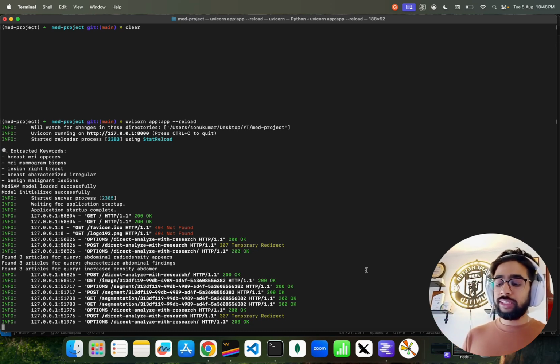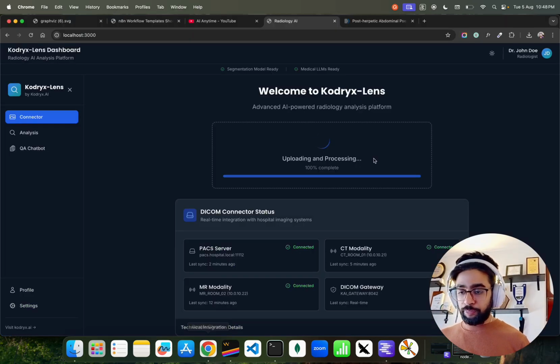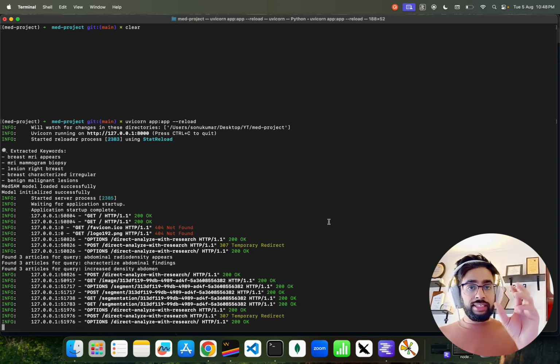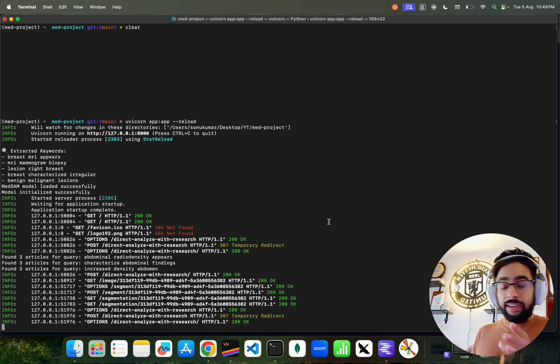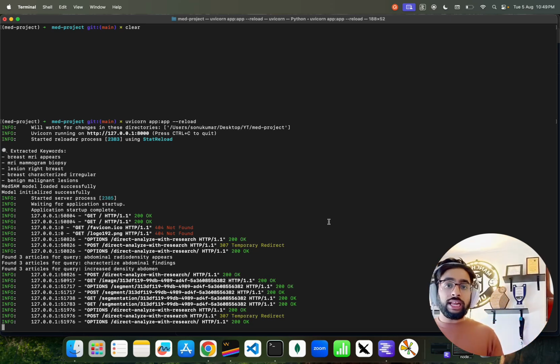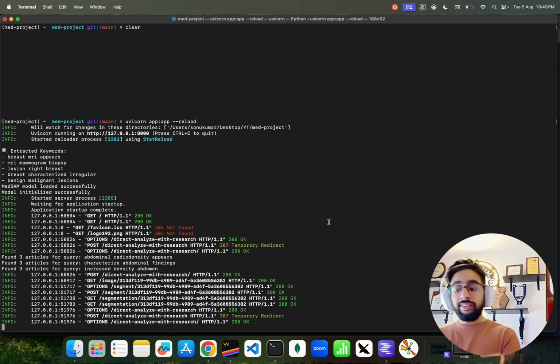You have to make sure there are no hallucinations and no bias and so forth. Let's go back now to this one. You can see it says uploading and processing 100% complete, as everything is running locally and it does not use any GPU as of now. I'm running it on my Mac machine, so it uses the Mac chip and no GPU that it can utilize on the CUDA side. It has some accelerator from the Mac and it runs completely locally, on premise, open source.